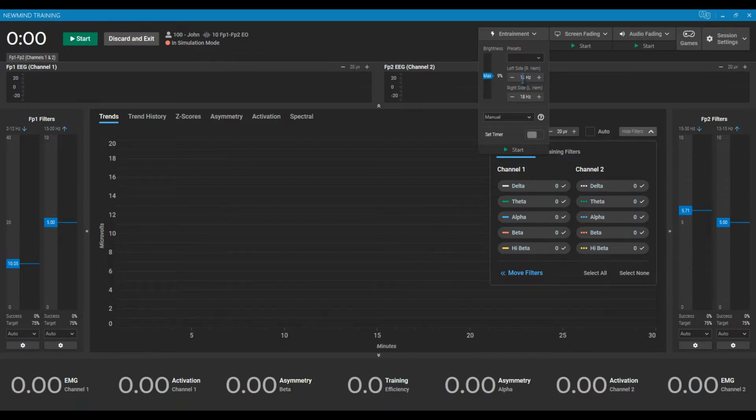Let's say our client's primary symptom was depression, so we're trying to affect the alpha asymmetry. With Photic, that's putting in, let's say, a 12 hertz into the proper side, and you're going to be able to encourage the brain to produce more alpha in the right hemisphere where it belongs.